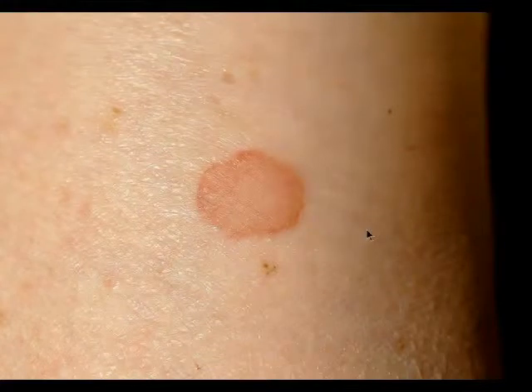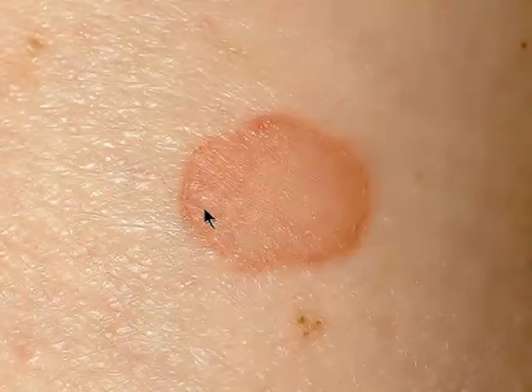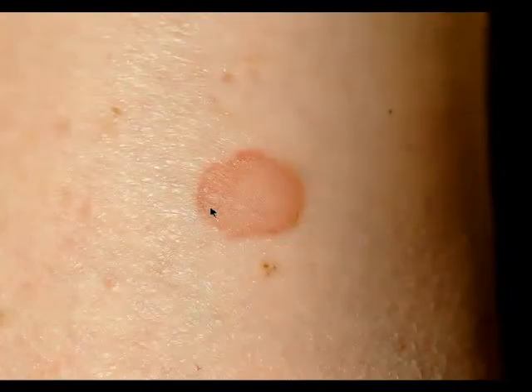Another example here, unpigmented lesion, slightly elevated. Clinically you can see a peripheral rim, and you may already suspect the diagnosis of porokeratosis. How does it look dermatoscopically? One pattern, dotted vessels only. Well, there are some linear vessels here, but you can disregard that. The main pattern here is dotted vessels, and we also see a peripheral rim.